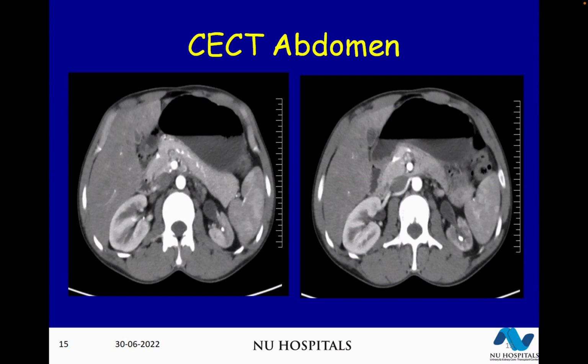Just one point here before you close shop. If you look at this stone, the so-called bizarre area of calcification, I would call it, it is surrounded by a hypodense area. You mentioned that. When you see this, it doesn't look like a stone. It doesn't look like a standard stone, what you're seeing on this particular frame.